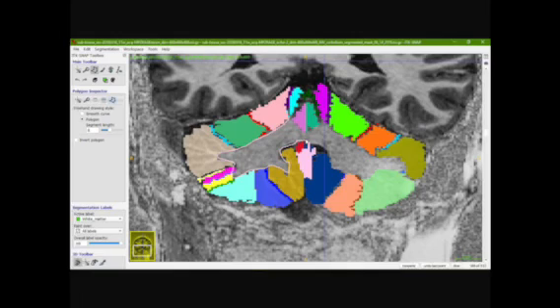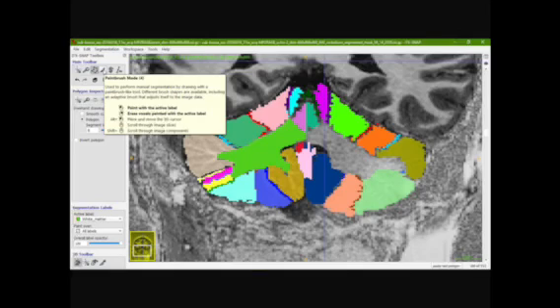And then let's say up to this point, just the right side. So you click enter, and that is going to do the segmentation just for that part that you were working on. You can also click on this in order to delete or eliminate it.